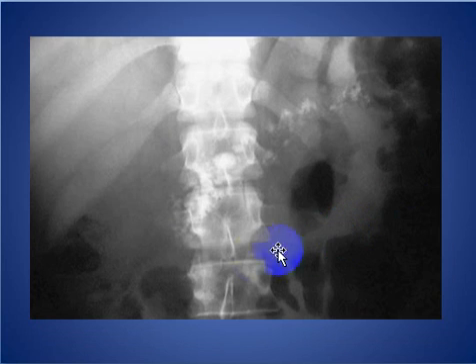The third case here is a patient with chronic abdominal pain and he has a history of alcohol abuse. As we see in the spot X-ray of the upper abdomen, multiple coarse calcifications involving the mid-upper abdomen going to the left side in the anatomic location of the pancreas. And this is consistent with chronic pancreatitis with calcification in the pancreatic duct.